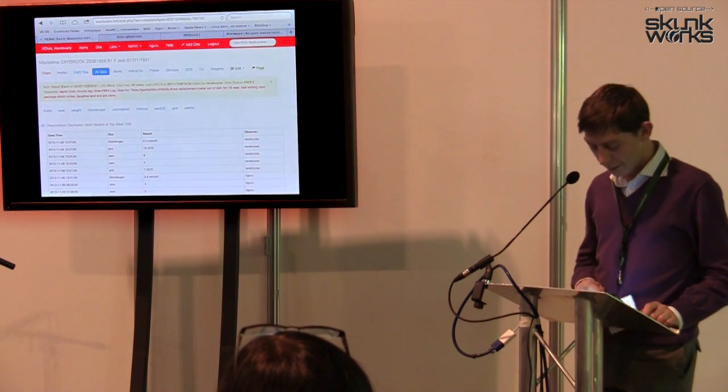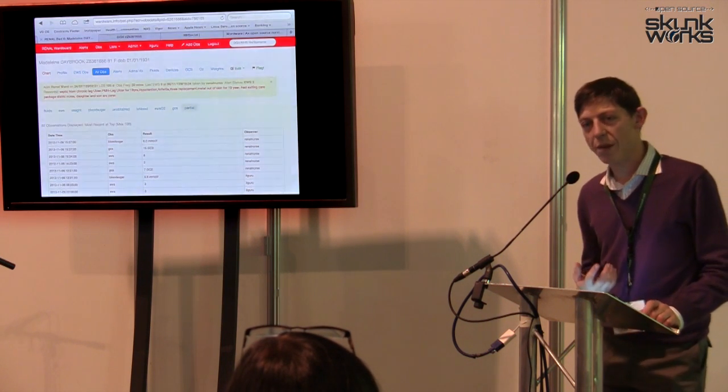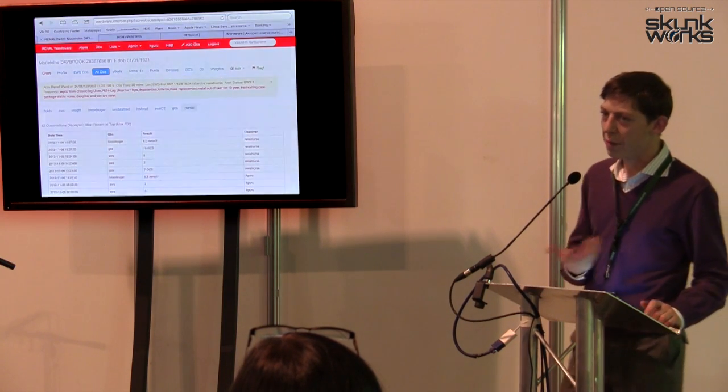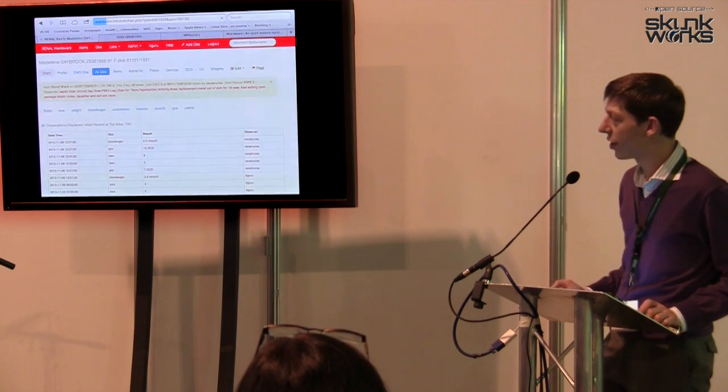And not only the EWS obs, but we can see all the rest of them as well. And we can toggle these on and off. So if someone does a partial set of observations because for some reason the equipment was unavailable, or for some clinical reason you weren't able to take the observations from the patient, you can also log partial observations as well.